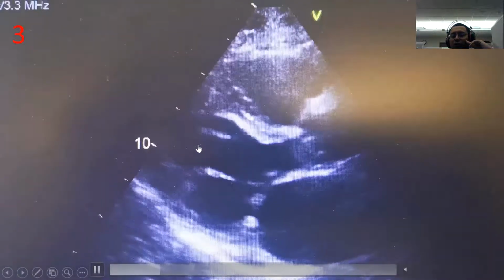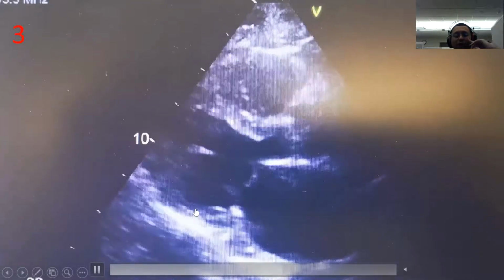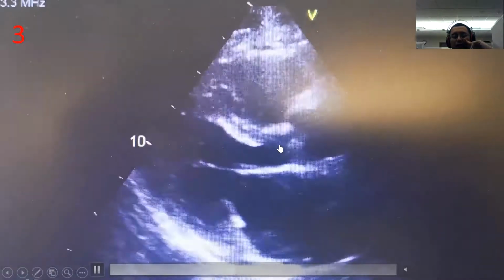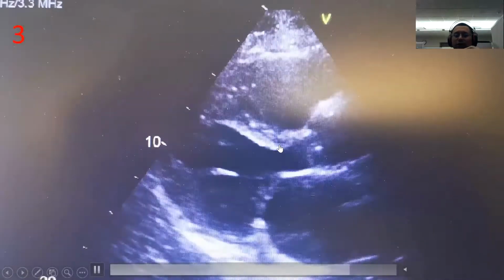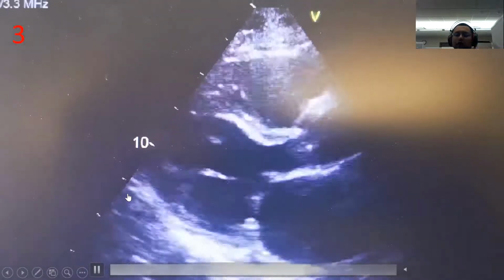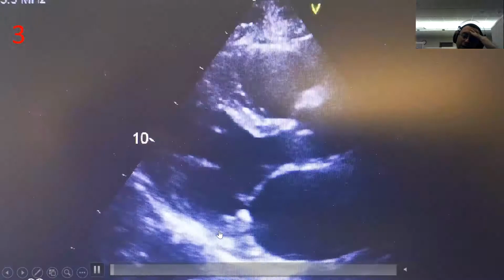The ejection fraction is usually not worse than 35%. Once it goes worse than 35% and starts having global hypokinesia, regardless of whether it is coronary artery disease or not, then it has become dilated cardiomyopathy. This is a different subset of functional MR.